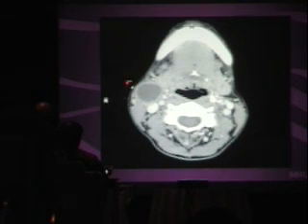So in this case, this was just an infected branchial cleft cyst, and you can see a lot of the nodularity and irregularity of the wall is pointing in. But there is some differential to this. And of course, when you're looking at a single image, you're not seeing the full length of this. Is this round and spherical? Is this more sausage-shaped? Let's say this ran all the way up and down the neck, anteromedial to the sternocleidomastoid.